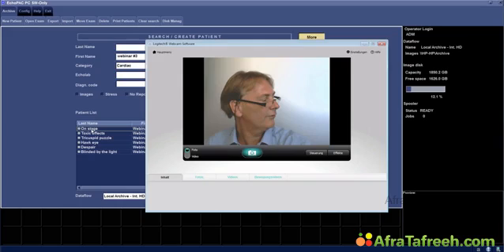Case 2, Yvonne wants to know how about the mitral regurgitation? Is it due to MI or coexisting in the case 1?